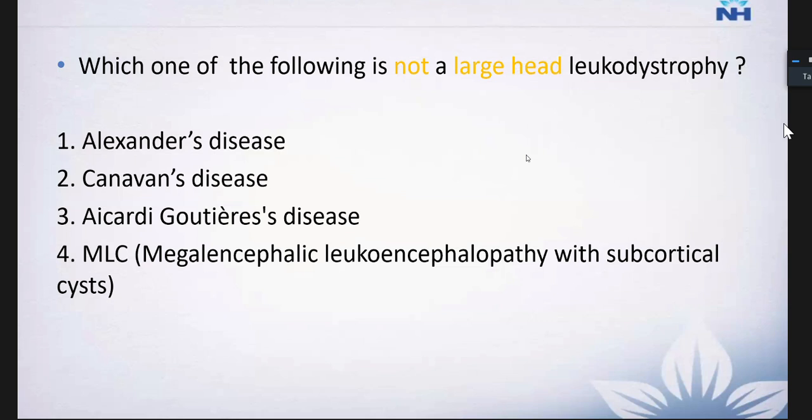One question I can see is that in 3 Tesla MRI there is no inversion of lactate. No, no, no. You will see inversion of the lactate peak in 3 Tesla MRI also. When you do the intermediate TE, you will see that there will be an inverted peak.